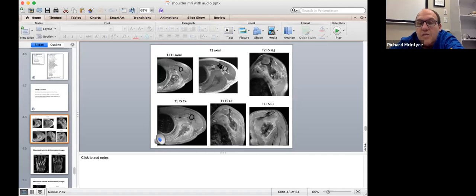Okay, T1 axial is very good to show the surroundings. Okay, we see mass effect, we see involvement. We might see involvement of the tumour in the normal bone or the normal muscle. And then, of course, they're the sort of characteristics of the weighting, image weighting.